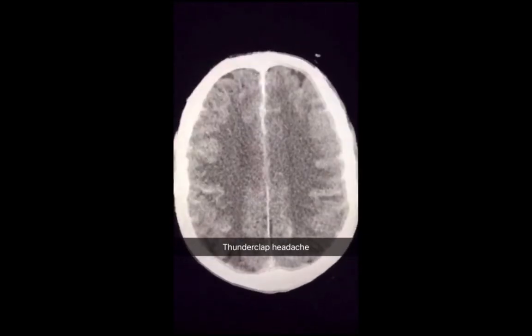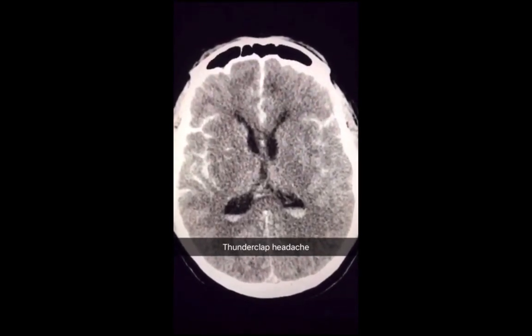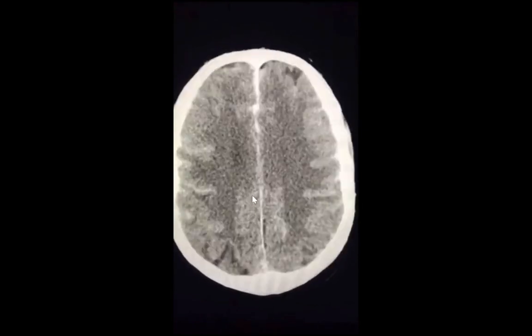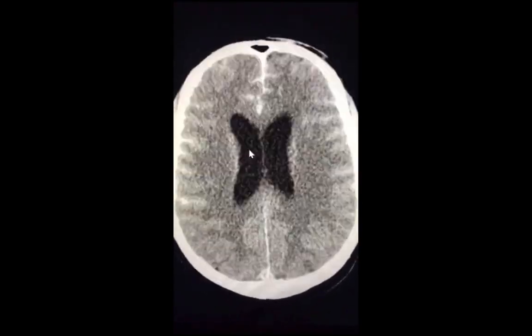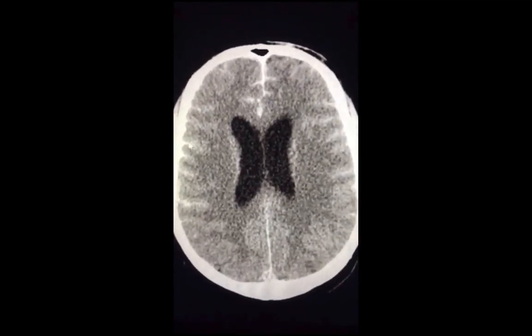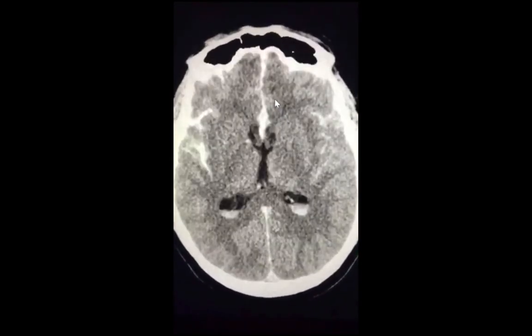This is an adult who presented with acute severe headache, the worst headache of his life. With such a scenario, the first diagnostic consideration would be that of subarachnoid hemorrhage, which is seen here. The CSF in the ventricles is dark, and the CSF in the sulci should be as dark as that. Bright, dense blood fills the sulci.